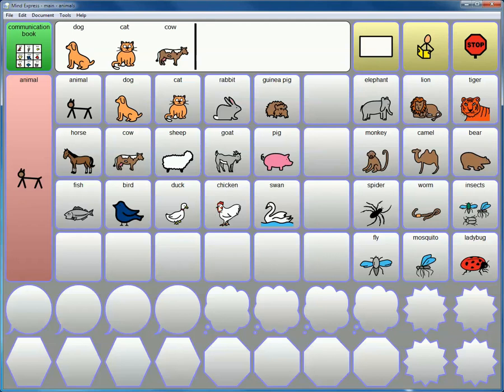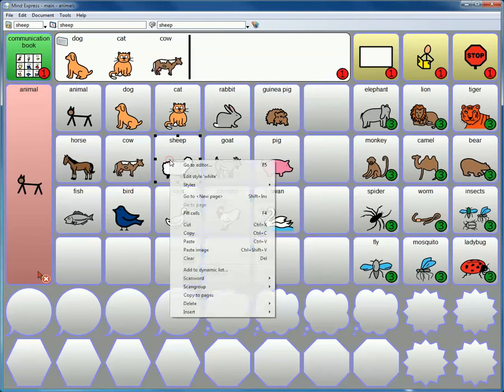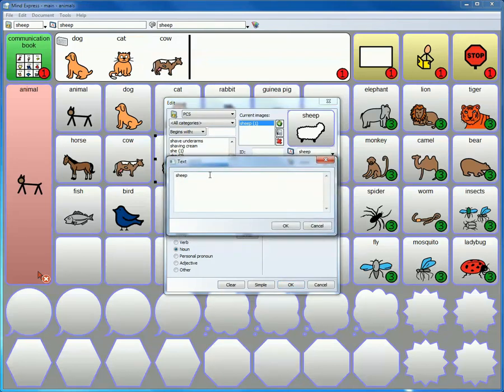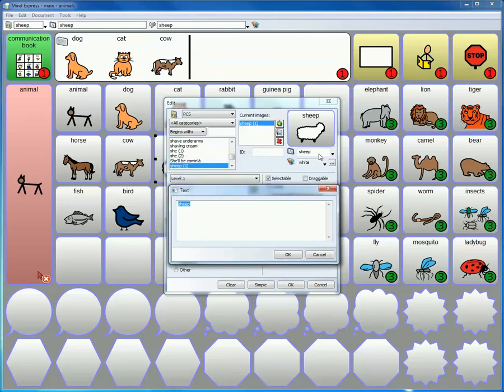Okay. Then another thing that's interesting is that we've added next to the label in the full editor this small triangle here. Now if you click it, there is an additional box that opens up and you have more space to type your label. You know, the space in this field in the editor may be too small. If you have a long sentence, for example, then you can just type your sentence.